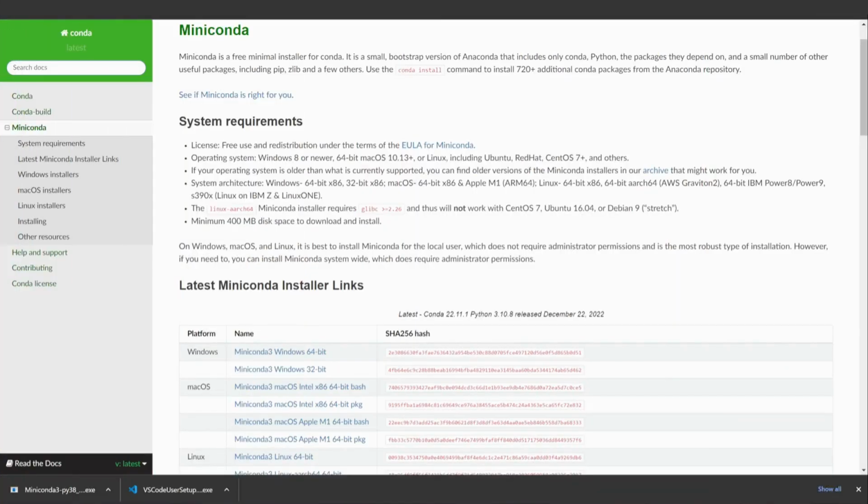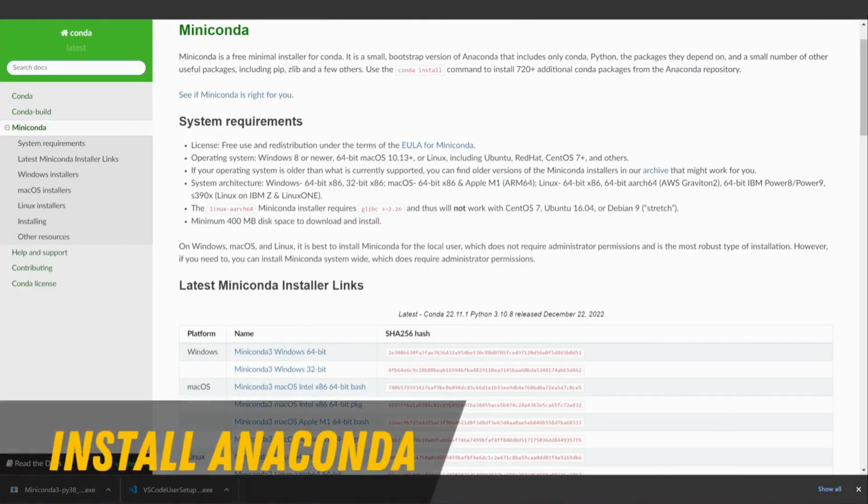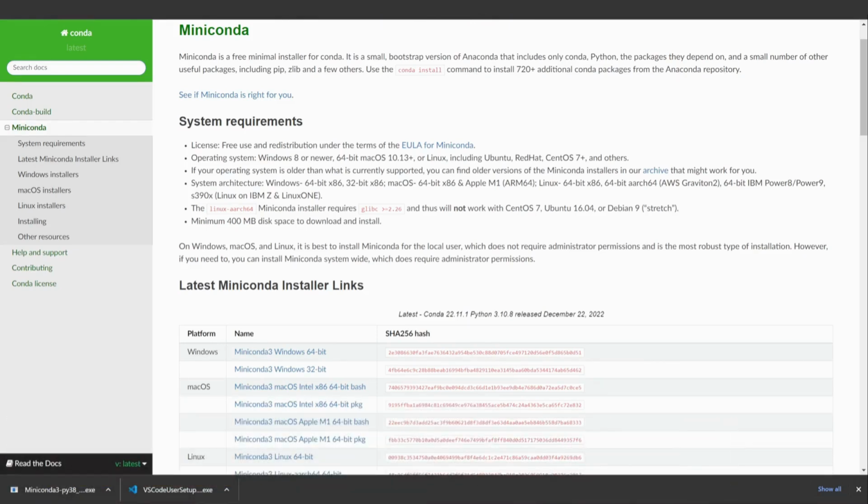And the next thing that we need to install is Miniconda. So for you, everyone depends on the way of coding that you use. For me, I prefer always using virtual environments. I don't like to install any Python packages directly in the base environment, which is directly in the system, because this is not recommended. If at any time you install something specific for a project that you will not need after that, and this thing will be installed in the system, you may forget it, but it will take memory and it will cause some problems in your system.